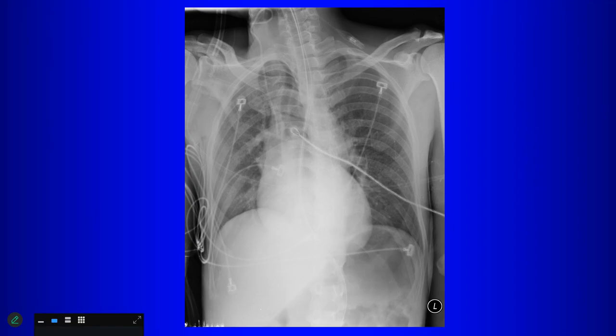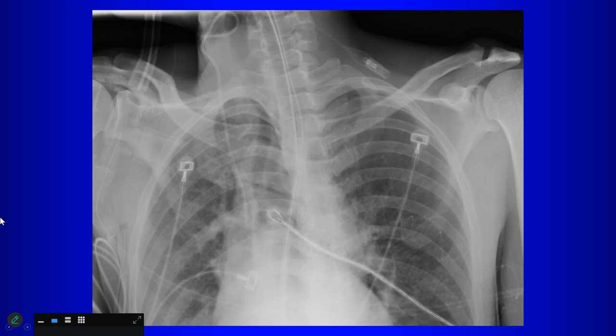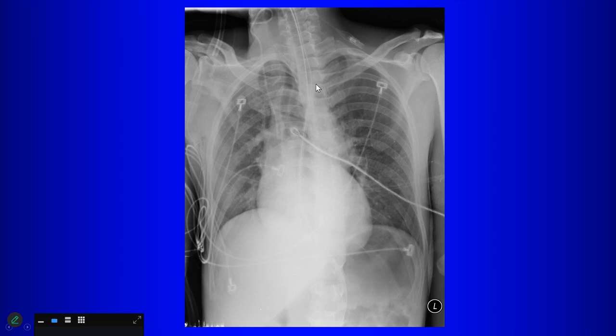Okay, so if we look at the lines for a second, right? I think we've got the right central venous catheter, right jugular guided. Is it a little bit curled up top? The central venous catheter? Yes, you see it superior. All right, I'll give you a close-up. Yeah. I mean, the ET tube is too... Where's the ET tube? Not overlying the trachea. It's in the esophagus. Here's the trachea. The endotracheal tube is in the esophagus. Okay, so go back to the original film. The ET tube is in the esophagus.